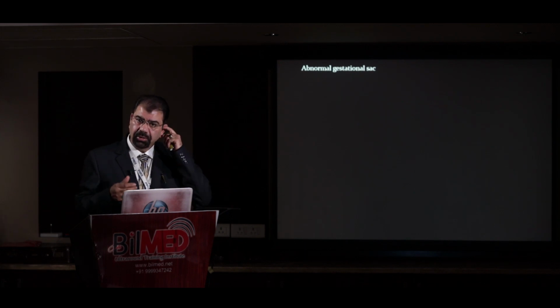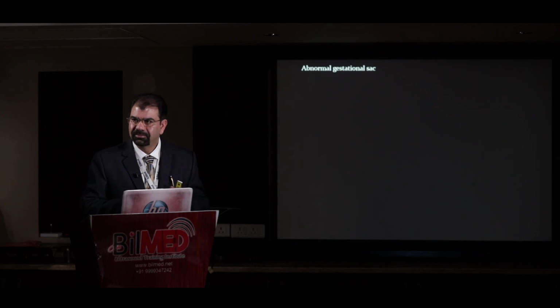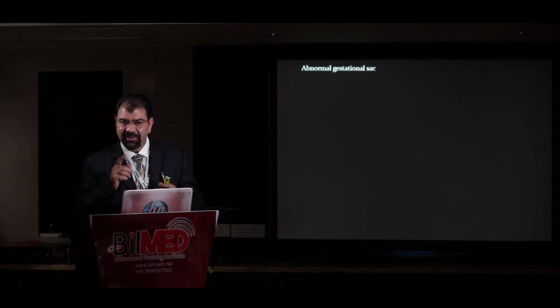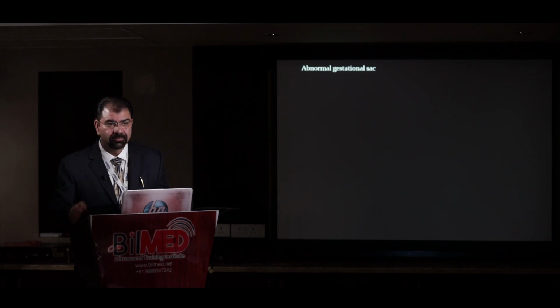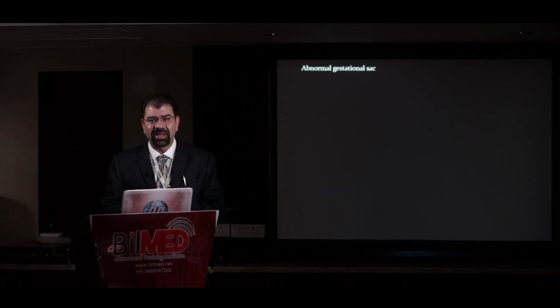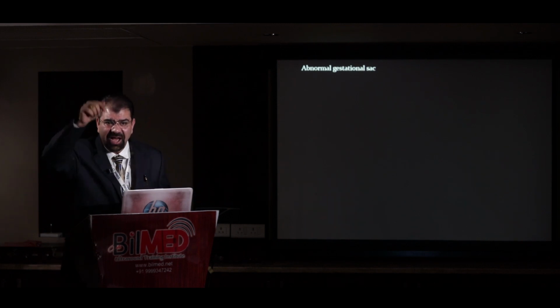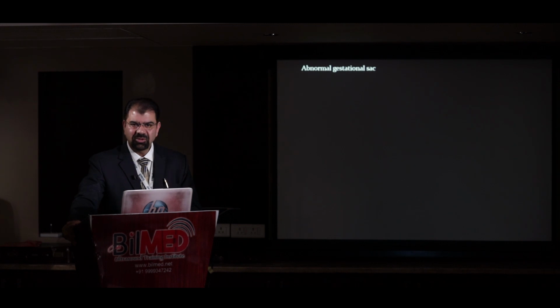That should knock your door. When a guest is knocking on the door, you get up and ask, who is there? In the same way, it should knock your door. Why am I seeing a CRL as per my expectation, but not a gestational sac as I am expecting? Why is the gestational sac very much less than the CRL? This is the point. Something should knock your door to get you to move.